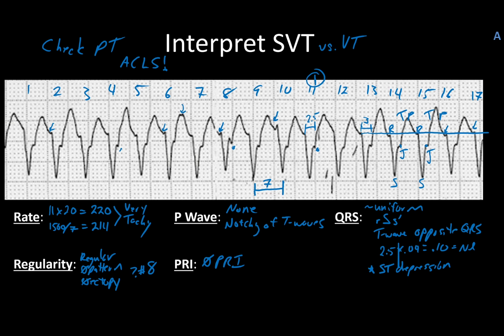Ultimately, we're very fast, regular, and uniform. We're going to go ahead and call that SVT.